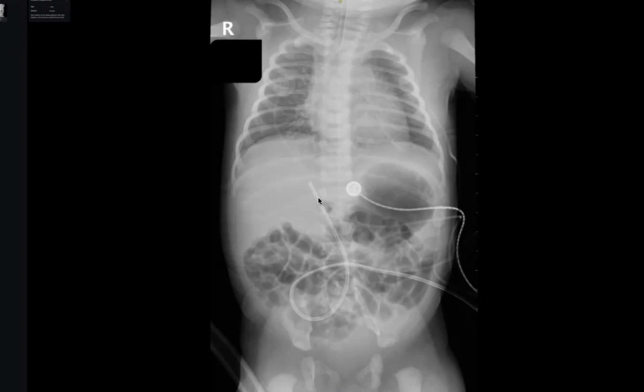Second, doctor, this is the umbilical vein, and it looks like the umbilical vein catheter is within the portal vein. Even if you didn't see the arterial catheter by your eye, tell the examiner this is a venous catheter. Because sometimes they put only one catheter, either venous or arterial, I have seen it before in my practice. Try to search for the other one. Look, the umbilical venous catheter is larger than the arterial.